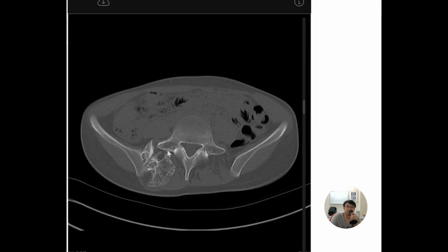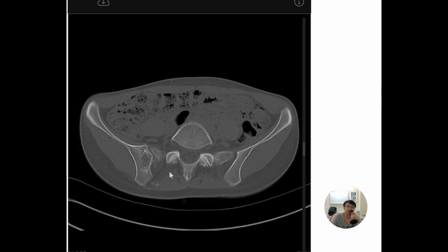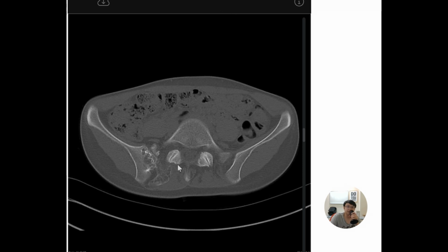Of course, the next thing we do is a cross-sectional image. And now you see that this is really projecting posteriorly. This bone lesion is arising from the ilium here. It has a cauliflower appearance, a projection with cortex and also some medullary bone. Such a projection suggests that it is an osteochondroma.